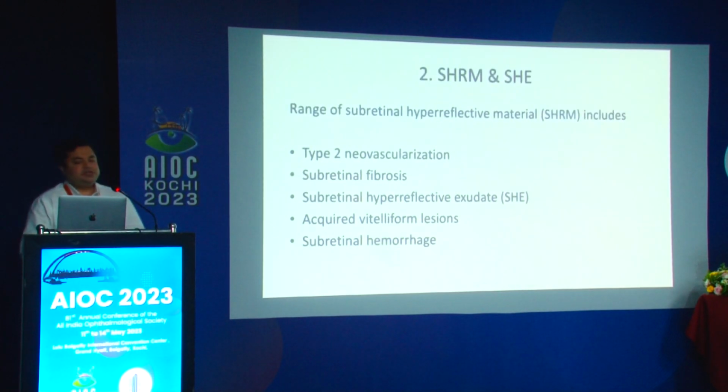Going to the next subset, that is SHRM and SHE. Basically SHRM includes a subset of type 2 neovascularization, as we saw in the previous presentations as well. Most of the presentations had the SHRM component.